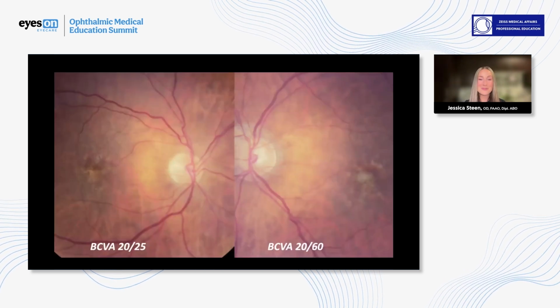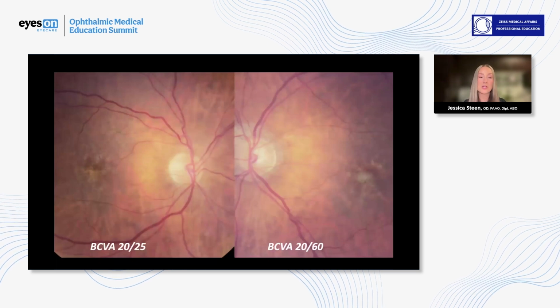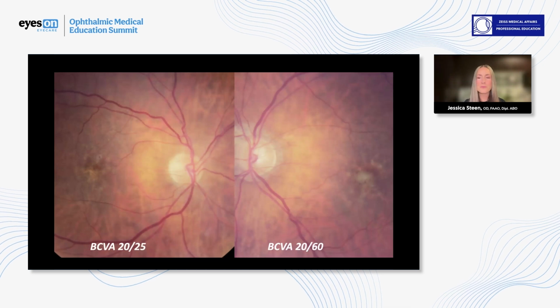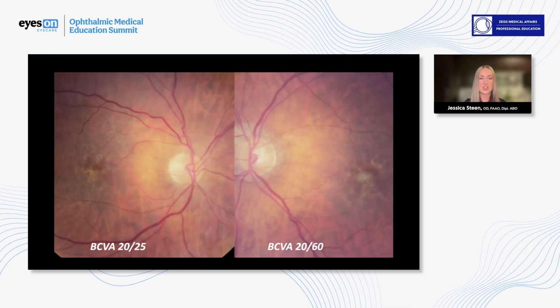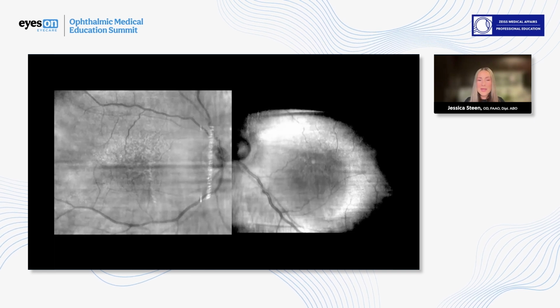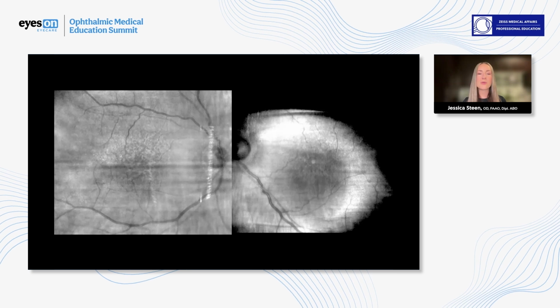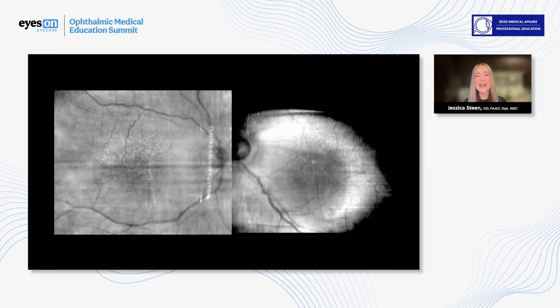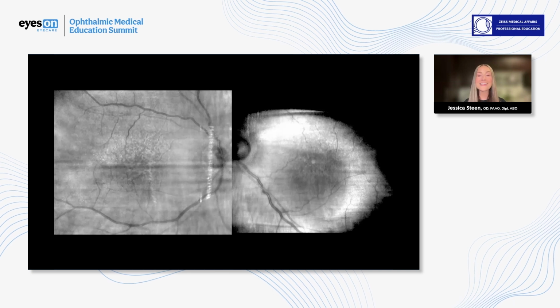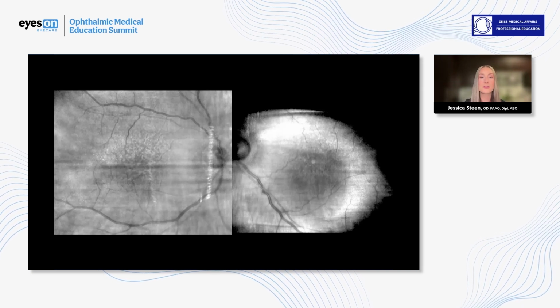Now, with color fundus photography, we clearly see an increased drusen load in comparison to the previous patient, with much more obvious or clear RPE abnormalities in each eye. Once again, infrared reflectance imaging, despite being imperfectly focused, especially in this right eye, shows a much larger area of the retina that is impacted. There is a greater extent of drusen versus what we see by color fundus photography alone.